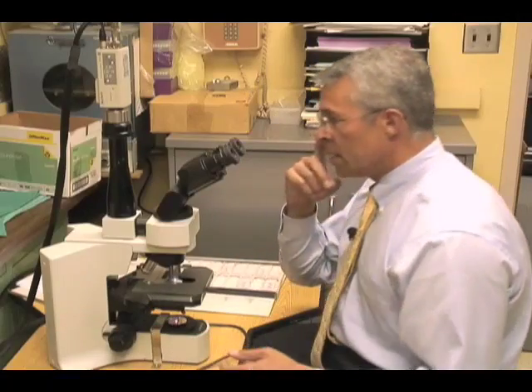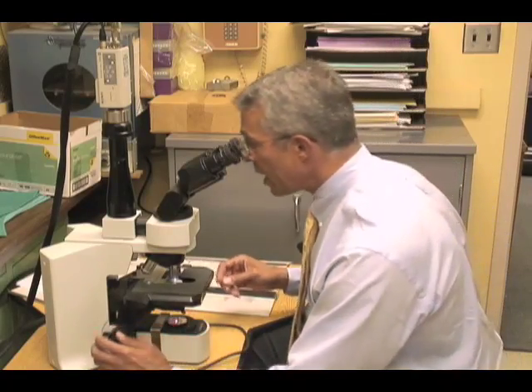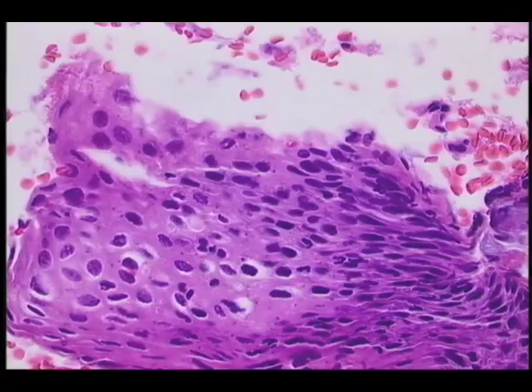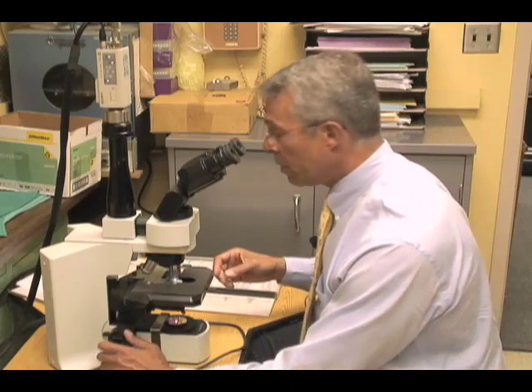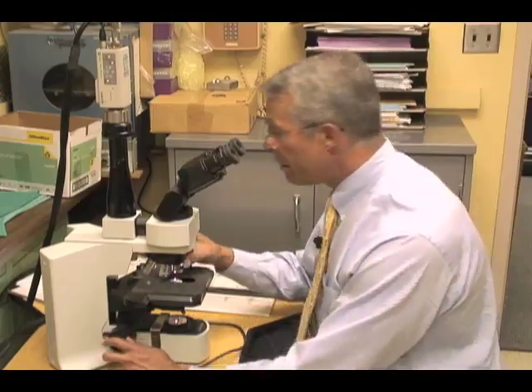And again, in difficult samples, one can apply immunohistochemistry to these slides, and applying stains such as Ki67 and P16, which have been validated in our lab, are in fact very helpful in cases where one has the differential diagnosis of atypical metaplasia versus CIN.